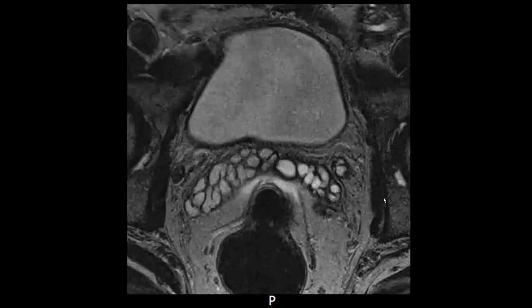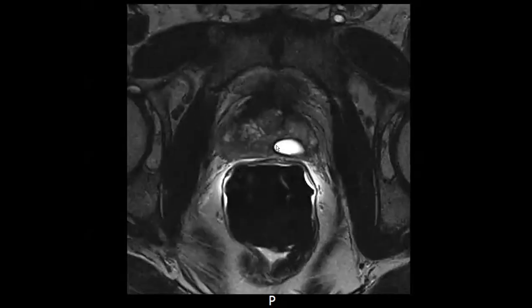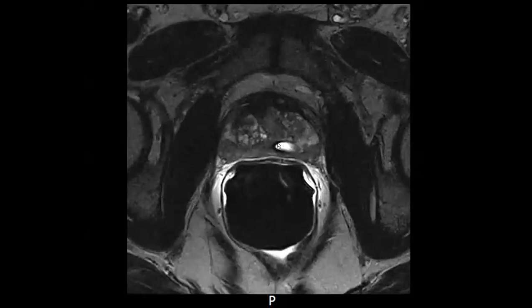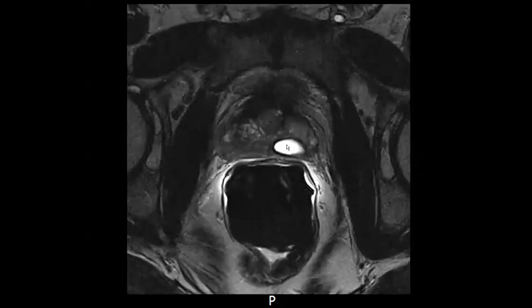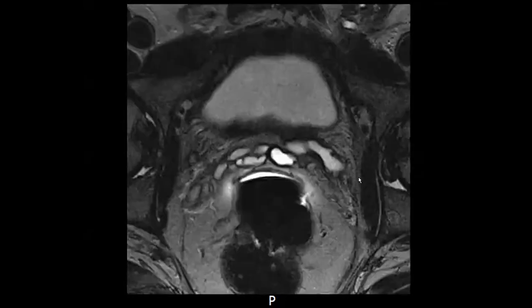Interesting, because that kidney looks so atrophic, you wouldn't think it would be making urine, but there's some kind of static fluid that's causing recurrent infection. Or maybe some reflux, because ultimately this common channel in the prostatic urethra will still receive urine from the right system and can still reflux back. Got it.